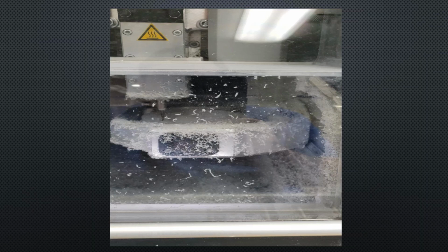I mean, a cabinet for milling is pretty much closed, and so if you shut that, you need a positive vacuum. You need a vacuum that draws through and really pulls the air, and they really didn't have that. Also, this mill had a deflector, a thing that focused the suction into the area right by the burr and the thing it's milling, and they had taken that off to have access.